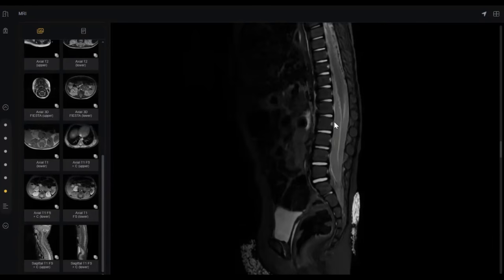But all this, from here to here, all this thickness, wow, maybe 2 cm along the lower part of the thecal sac, anterior and posterior, is drop metastasis. Okay, my colleagues. Thank you, doctor, so much.